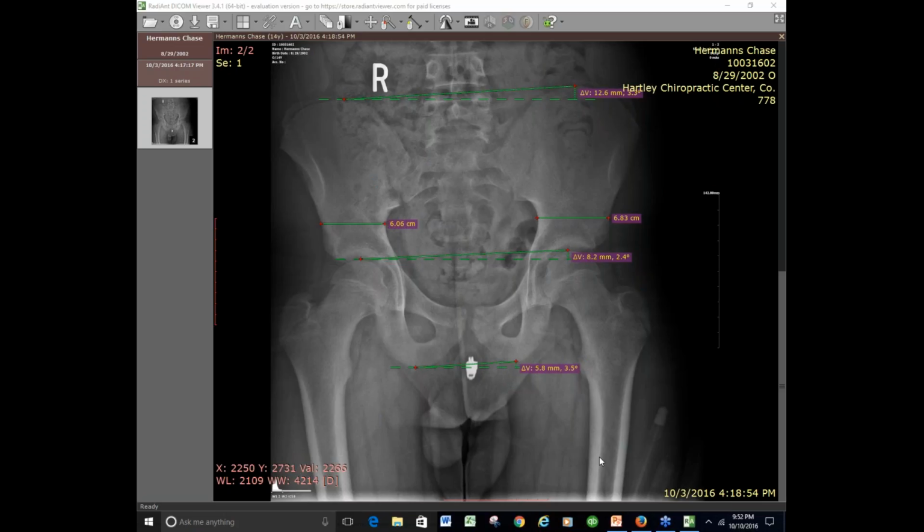So if it's white like that, that means all the X-rays were blocked by the bone, which means it's a very dense bone. That makes sense. And you'll see the compact bone on the outer layers is much more dense than the cancellous bone. Cortical is the outer layer. Cancellous bone in the middle is much less dense, so the X-rays go right through it. Makes sense.